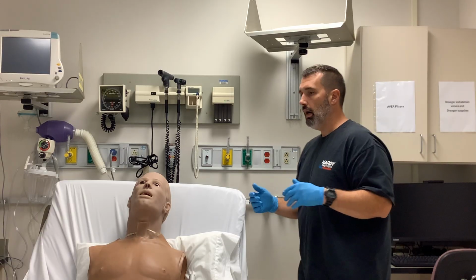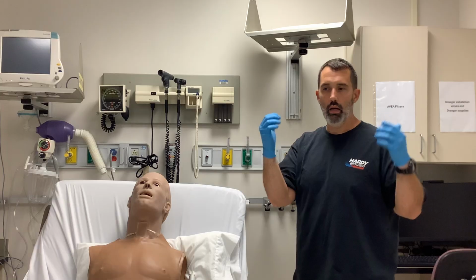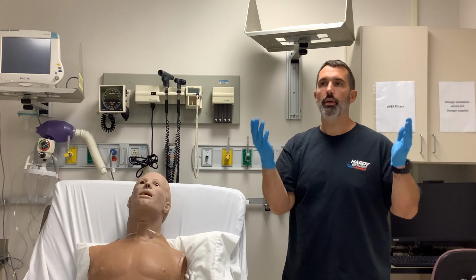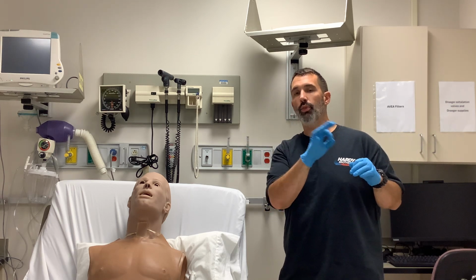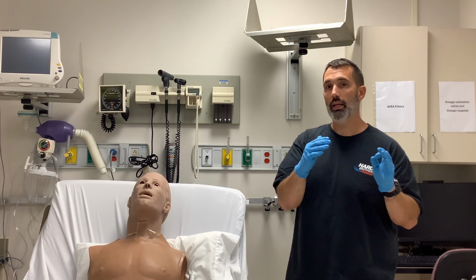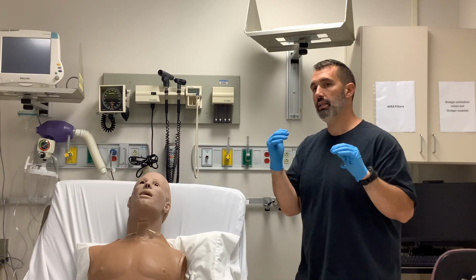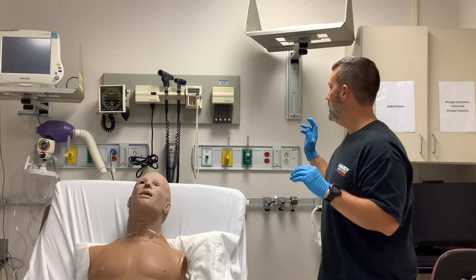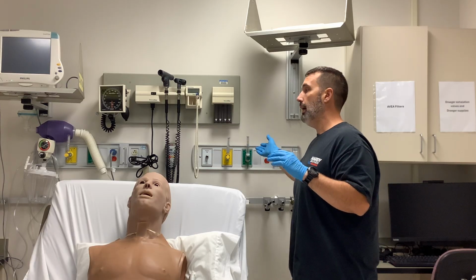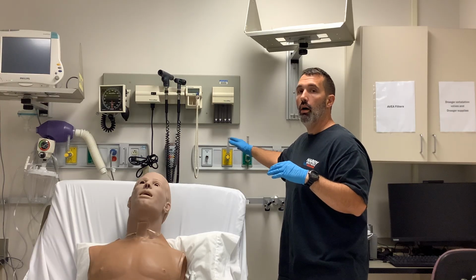So if you look at air to oxygen, and some people will do oxygen to air, but air to oxygen, the way that you read it, I'm going to set it at 40%. 40% comes with a 3-to-1 ratio. That means 3 parts air to 1 part oxygen. So if I want to give someone 40% and I set the oxygen flow to 1 liter per minute, then in order to achieve 40%, I have to match that 1 liter with 3 times that of air to bleed it in.